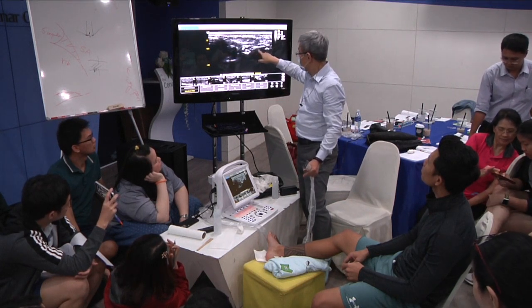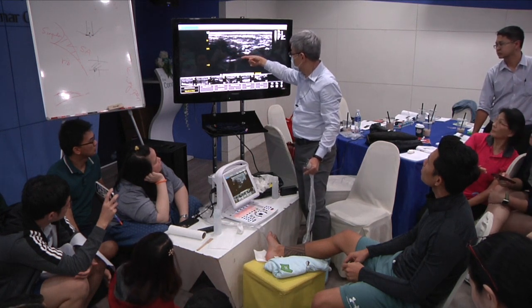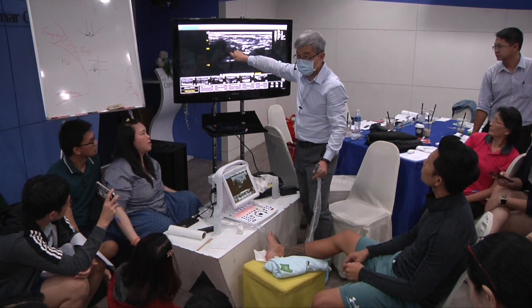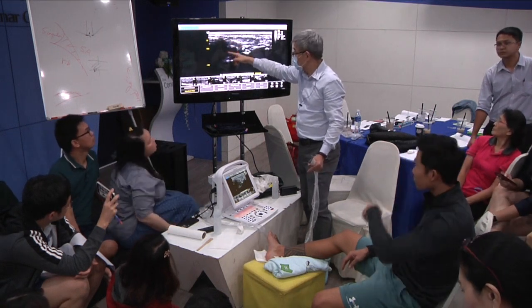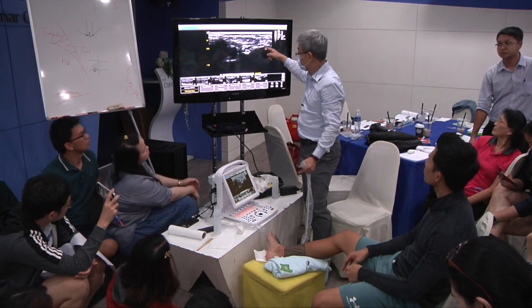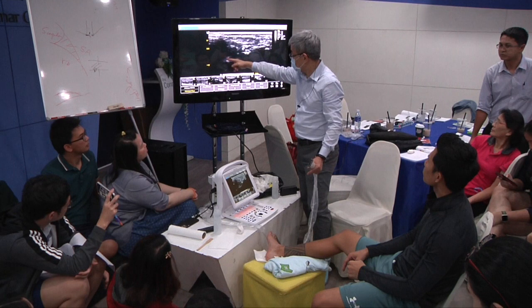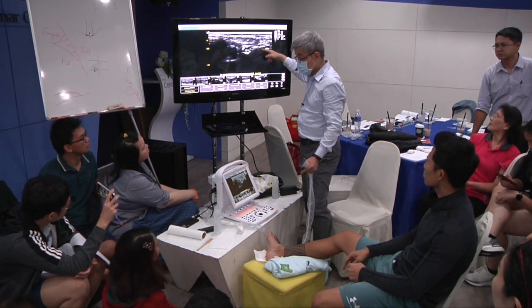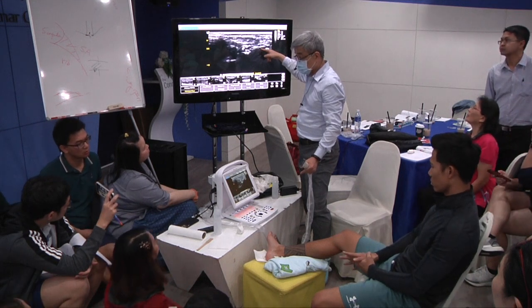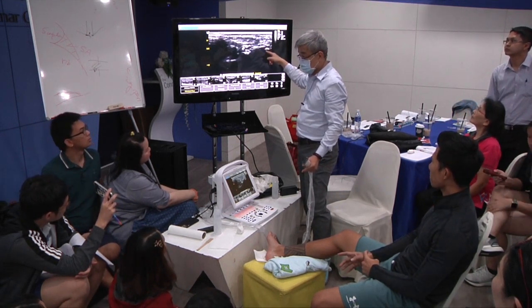If you see a ligament too close to the bone, that is not the middle bundle, because there is a huge gap between the tibia, talus, and calcaneus, right? This is the structure of the calcaneus.